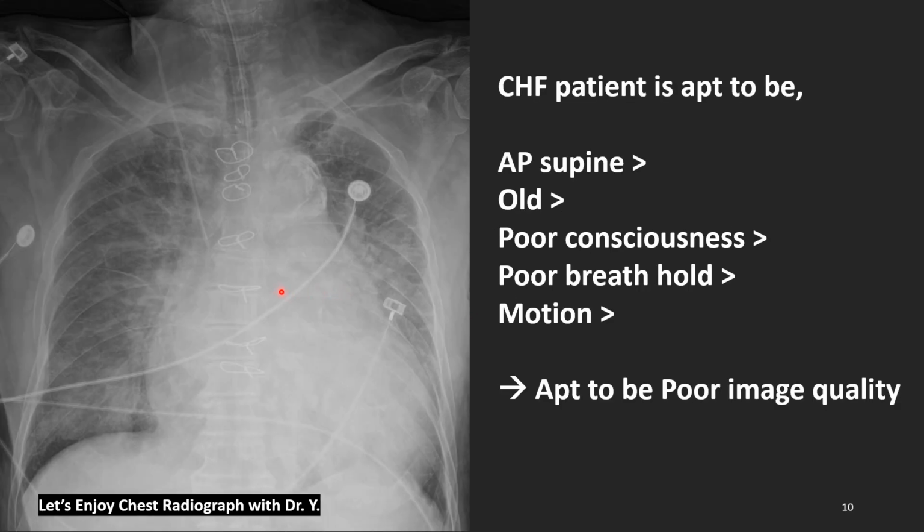Let's look closely at this film. What do we see? Endotracheal tube, sternotomy, aortic valve calcification, many lines of EKG, etc. Central line here.